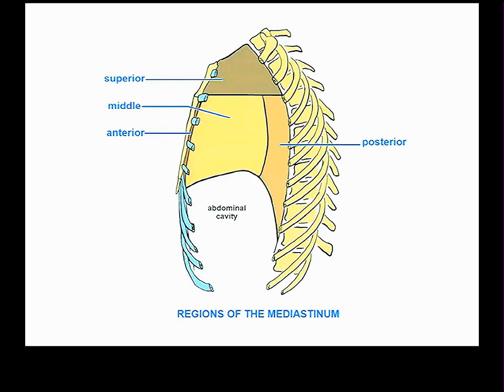Anyway, the superior mediastinum is defined as that portion superior to the pericardial sac. The posterior mediastinum is defined as that portion posterior to the pericardial sac.